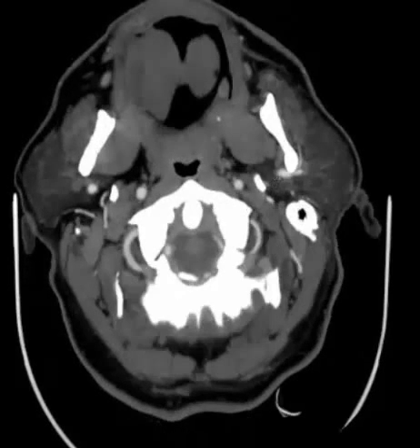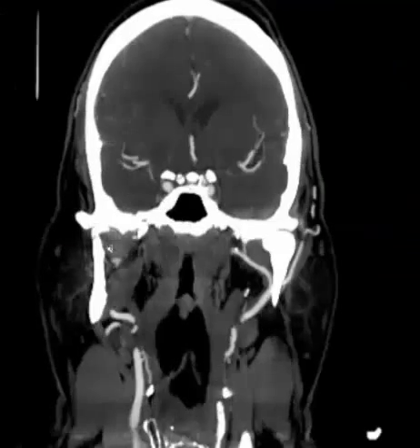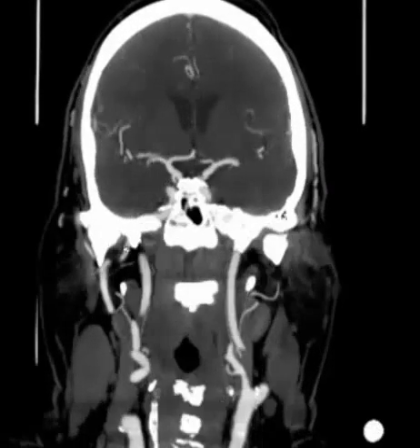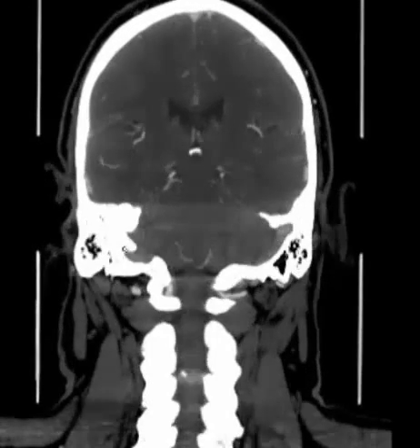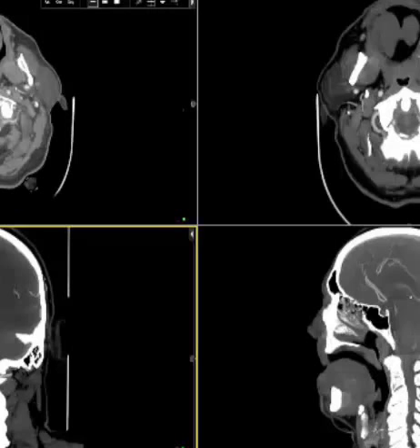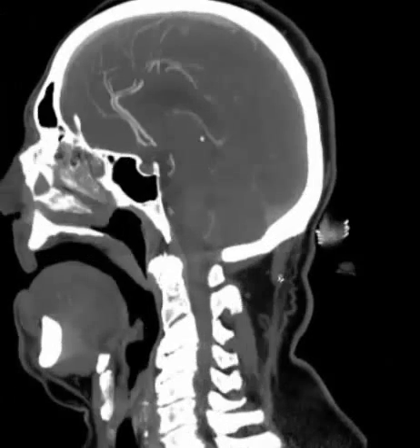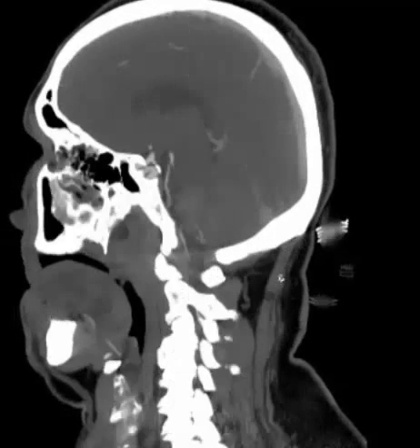And after finishing the axial MIPs, I use the coronal MIP images to confirm some of the findings, including looking at the vertebrobasilar system even better. As you can see, it gives a full-on view of the system. And the sagittal MIPs is really just good for ACAs.